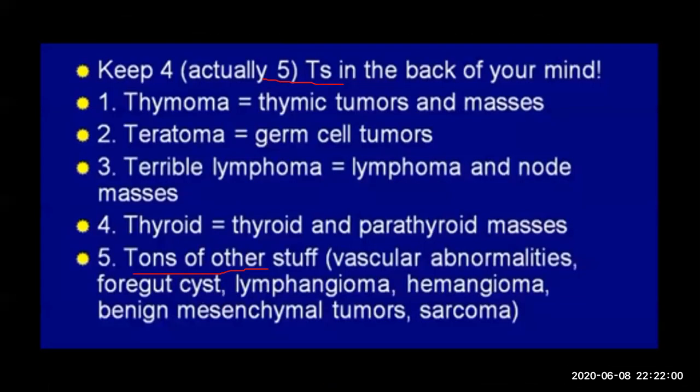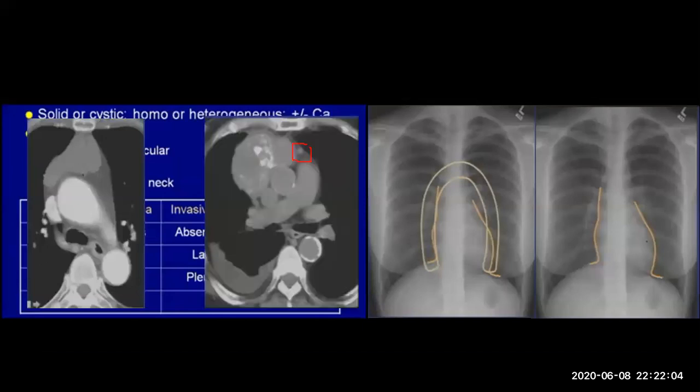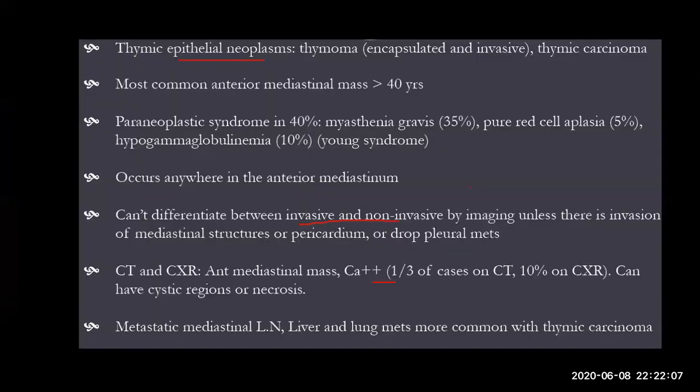Okay, any question on this? Okay, this is classic thymoma. Our case is finished, thymoma. Okay, next case. We will not talk forever. You should know the age. Anyone who wants to volunteer? Volunteer? Anyone?